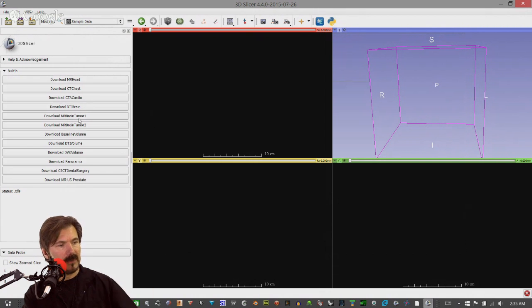And so you might see, even though they provide the same kind of grayscale images, they all react differently, so they provide different information. So here we're seeing both MRIs and CTs, and then we also have what we call a DT volume. Does that make any sense to you, Javin? Yeah, DTI. It's similar to MRI. It's a different imaging modality.